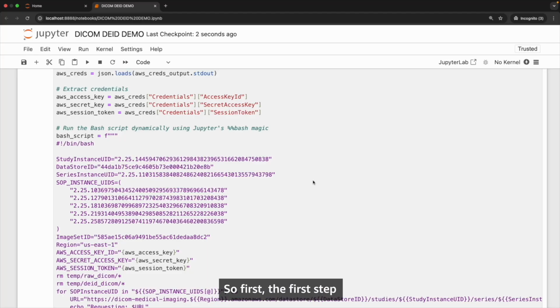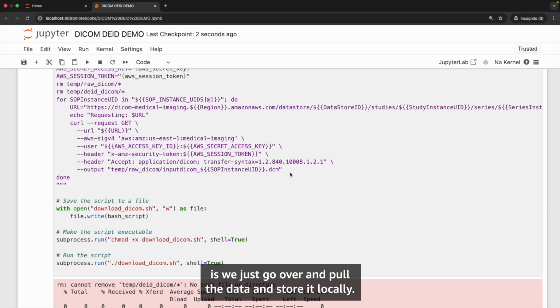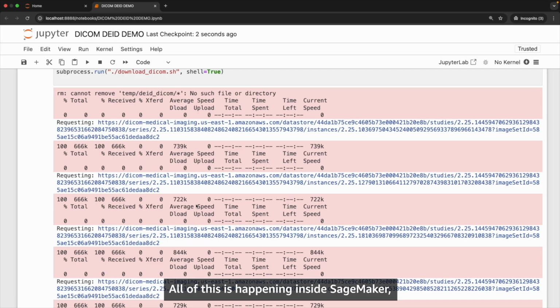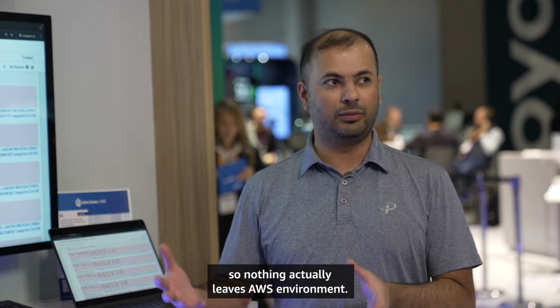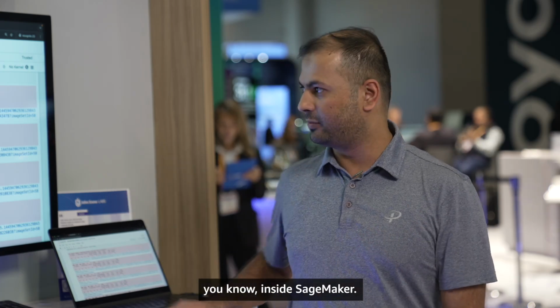So the first step is actually to pull data from AWS HealthImaging. We do that by using AWS libraries, and the first thing, as you can see in the code, is we just go over and pull the data and store it locally. All of this is happening inside SageMaker, so nothing actually leaves the AWS environment. The code and everything is running locally inside SageMaker.